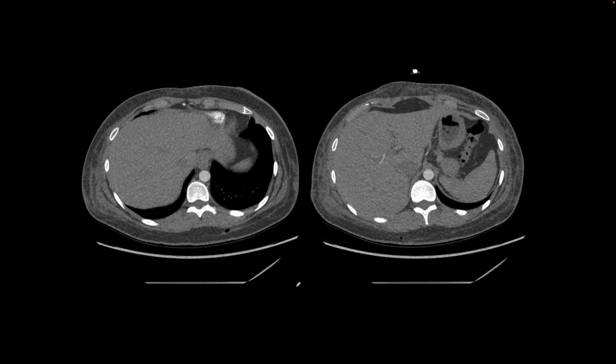This is our next patient. They had a tummy tuck procedure where subcutaneous fat was removed. We see some scarring, and we see a focus of air here, a focus of air here. And so frequently after surgery, they may present with abdominal pain or chest pain, and a CTPE study may be performed. And the utility of this study is to, one, rule out PE, which AI Doc does very efficiently. Two, in a post-surgical setting, look for any fluid collection such as seroma, hematoma, or abscess formation, which we did not find in this patient.